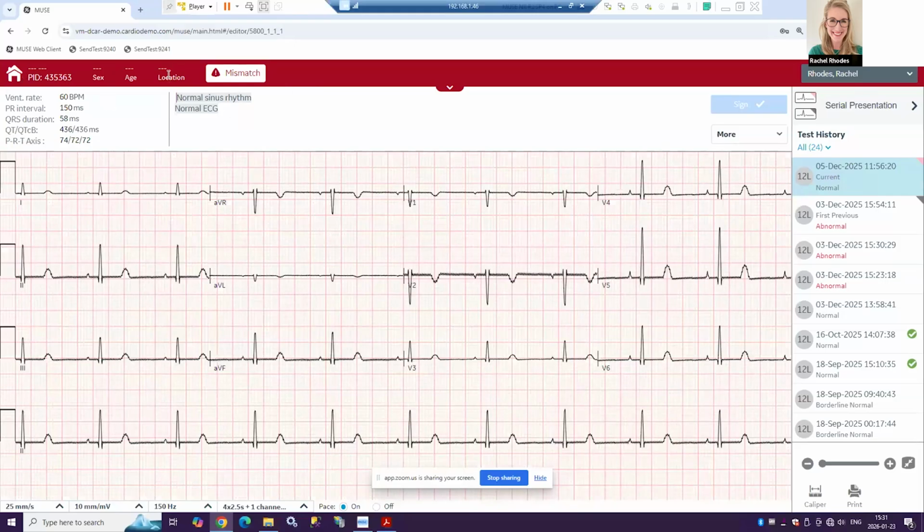You can also see along the top here, I don't have any patient information, so it makes sense as to why I'm seeing that. In this instance, I would not be able to clinically confirm this ECG, although I could look at it and do the analysis and save it as diagnosis complete to be reviewed later and have their demographics completed or confirmation accepted.